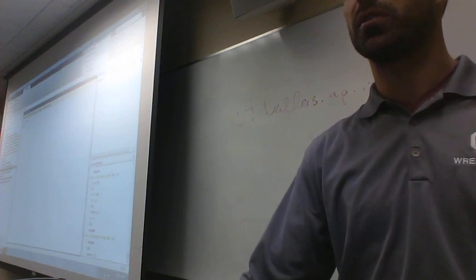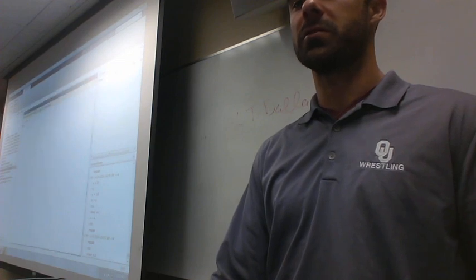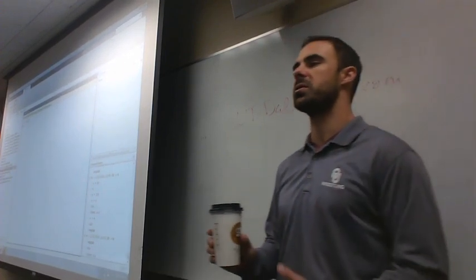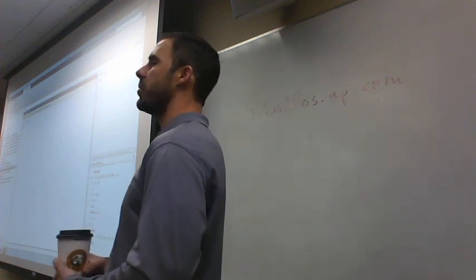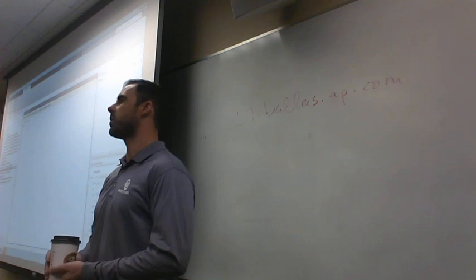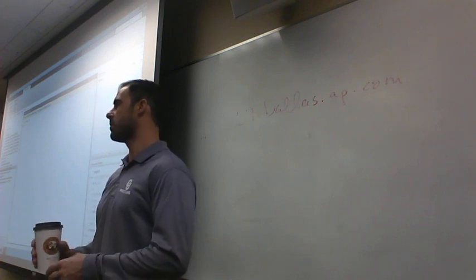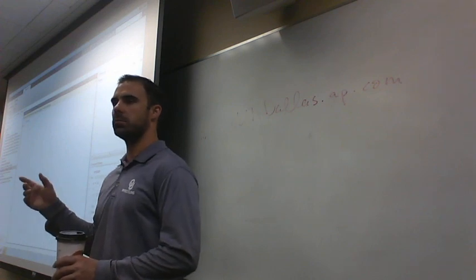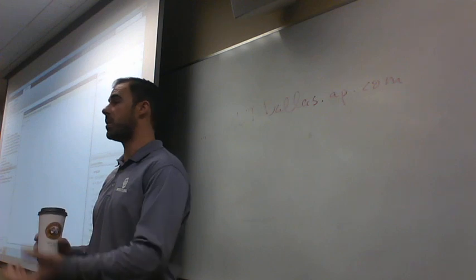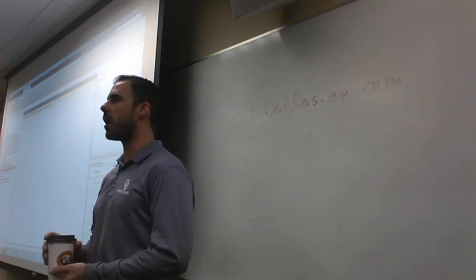I can edit that. Anybody having trouble with this? So these are just examples of little things that you can do. As you move through the semester, you can start taking your own autonomy. If you find yourself always typing the same thing in the command window over and over again, you can take your own liberty and create your own shortcut buttons or whatever you desire in your own data analysis. But I just wanted to use these as small examples for that.